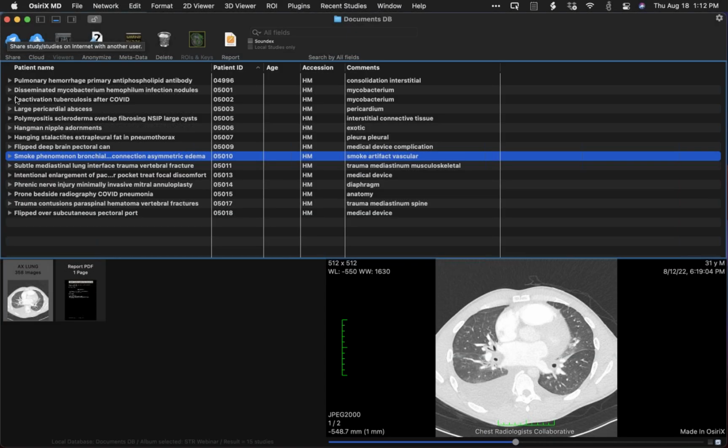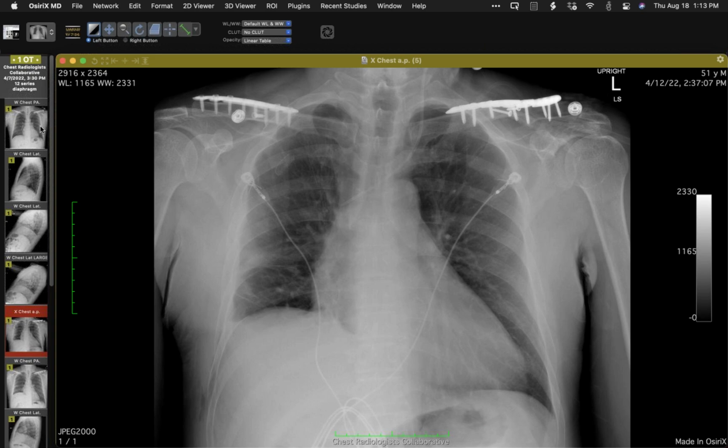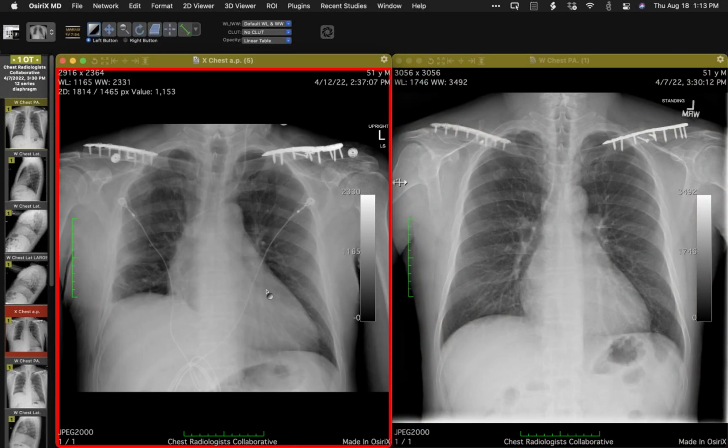All right, let me show you. Well, again, I'll show you a couple of these because maybe some folks that are watching like to see diaphragm evaluations. So here's the context. Here is a prior exam in this patient. And what happened between these two and more recently was a relatively minimally invasive procedure to address the mitral valve.